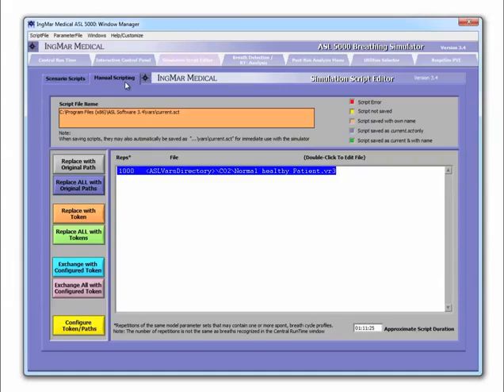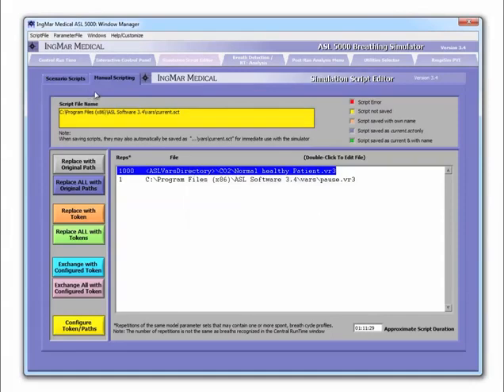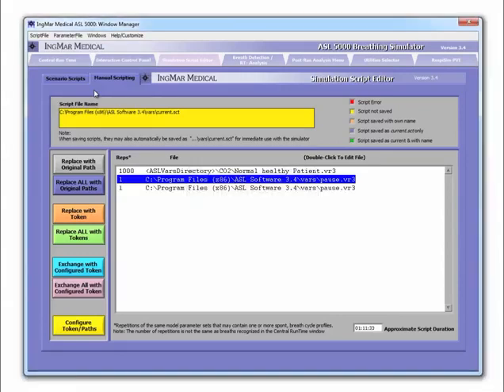What I mean by that is in our script editor, we can add these files one after the other and simply keep adding them infinitely so that we can go in, edit them, change them, string them all together, and create what we call a script. So a script is the recipe, the files are the ingredients.